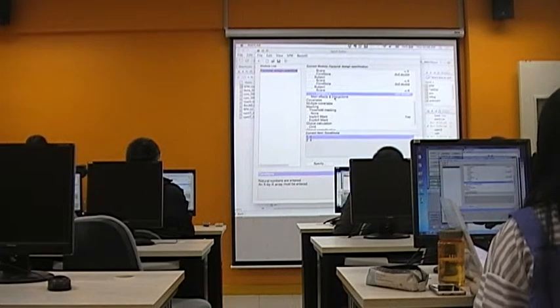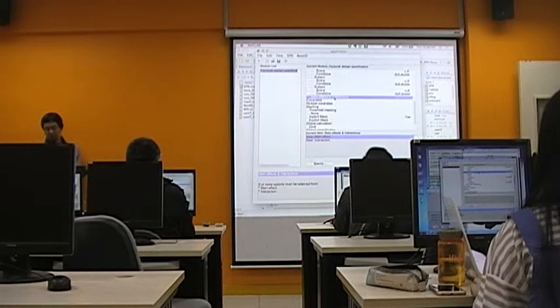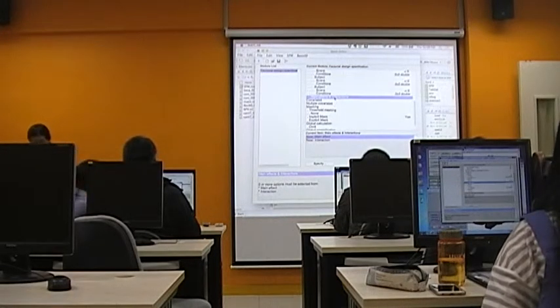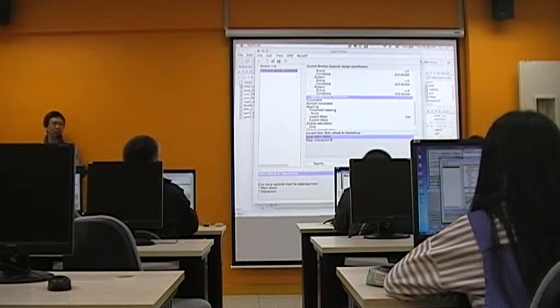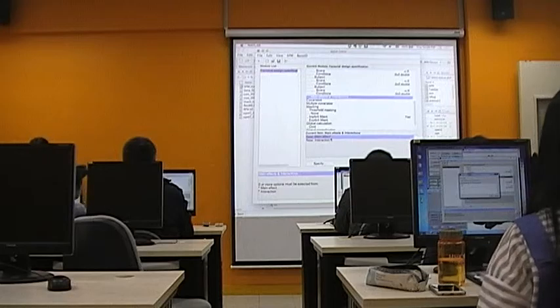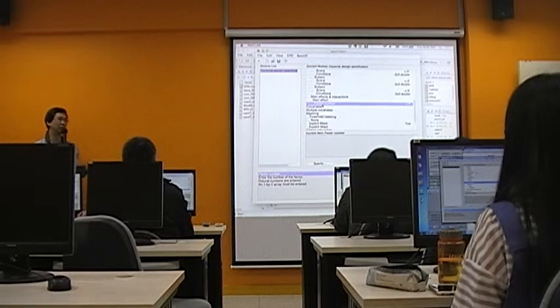And so let's imagine that you've put in all this, and then you have the option to choose what effect you want to examine in your model. So let's say you could have a main effect. Let's say I'm only interested in the main effect of working memory. I don't really want to look at the subject main effect, and also I'm not interested in whether there are any working memory changes according to the subject, which means the interaction. So I could simply choose one main effect, and you need to put in the factor number.